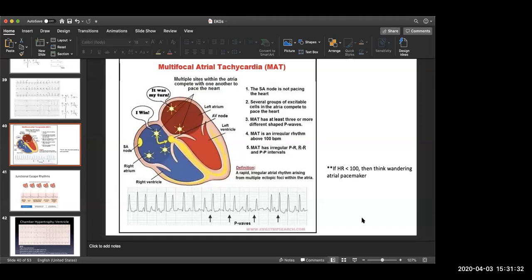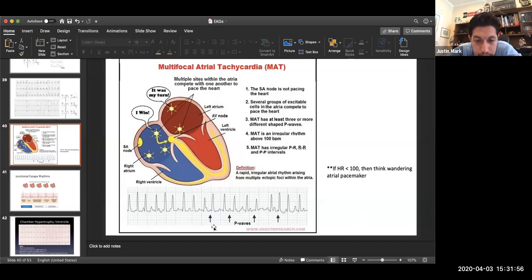Okay. So Justin, another question I always have is, how can you tell if it's a P wave or a T wave? Like you see how that second arrow is pointing at that wave? I can't tell. I guess what Miguel said is where you would go after, but is there a way you could do it when they just give you one lead? That's a good question. And I gotta admit that sometimes I struggle with that too.